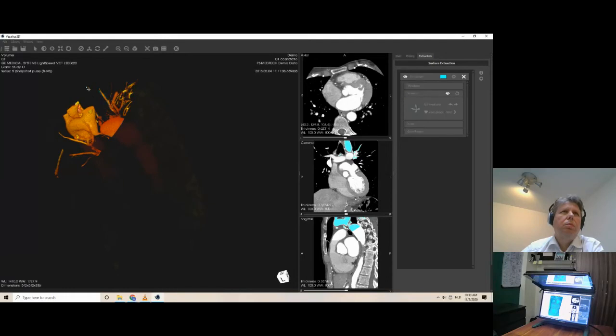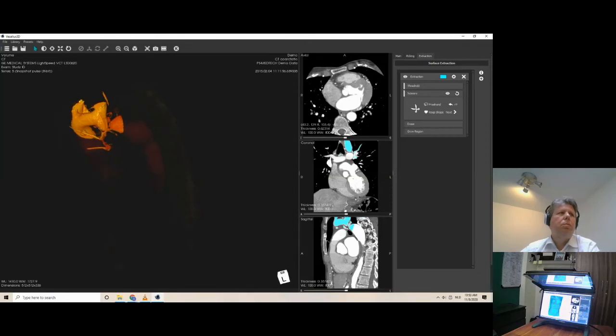And you will figure out, the moment you're good at this, you have some more experience, you know what you want to keep. You make your selections real easy, real smooth. Going to make one more thing. I want to keep this. Get it out of the way. Okay, this is what I want to keep.